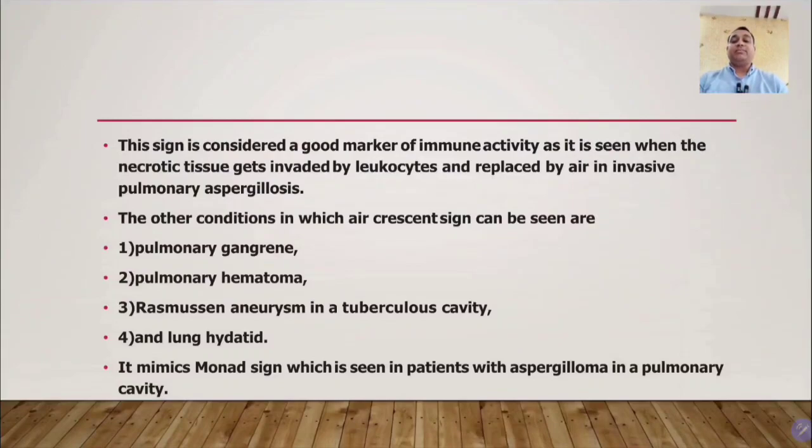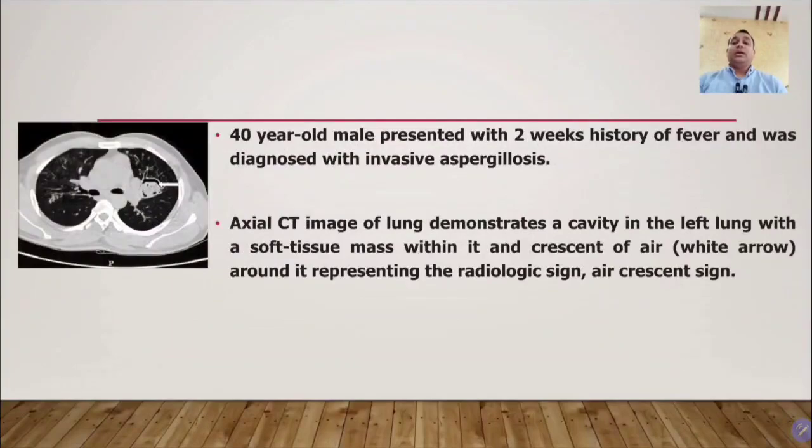The air crescent sign mimics the Monad sign with a few differences, which is seen in patients with an aspergilloma in a pulmonary cavity. We will discuss the Monad sign in the next lecture. So let us discuss a few examples.